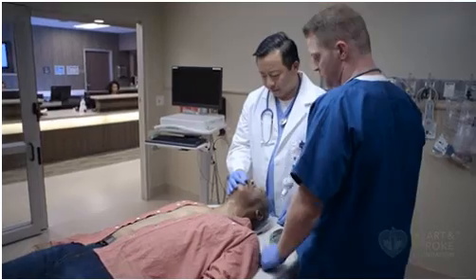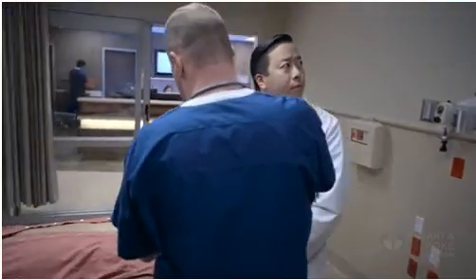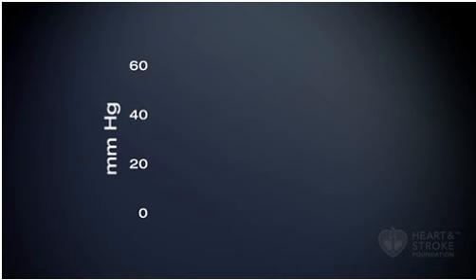Waveform capnography devices that display both a waveform and a number will give you the most comprehensive information. Connect the monitor between the advanced airway and the bag or ventilator. Waveform capnography provides a graphic demonstration of the carbon dioxide exhaled with every breath. Humans with healthy lungs have a characteristic waveform that is divided into 4 phases that occur during inspiration and expiration. When the patient first begins to inhale, the curve falls sharply to zero. As the patient continues to inhale, the reading on the monitor should remain at zero.